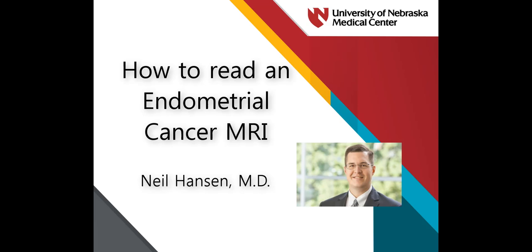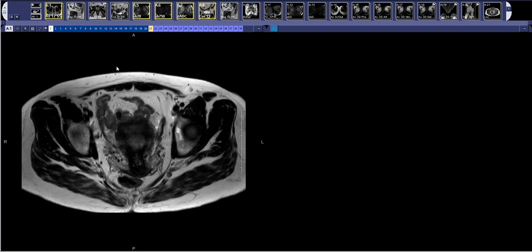Hi, this is Neil Hansen, and I'm taking you through an endometrial cancer MRI. So this is a pretty similar body protocol to the other body protocols that we've talked about in other videos.